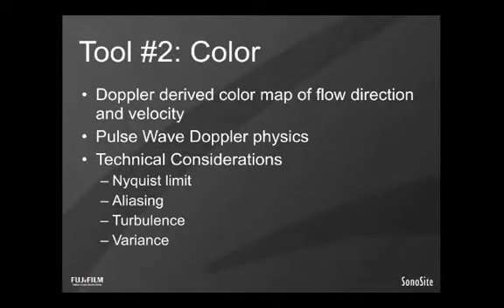So having proved to you the merits of an eyeball technique, we can then move on to the most common method by which valvular lesions are screened for their severity, which is the use of color. Now, color Doppler is derived from pulse wave Doppler physics, as you may recall, and really it assigns a color map to the direction of flow and allows us to evaluate how much flow, very subjectively, may be going in the wrong direction or maybe accelerating in flow, leading to aliasing. And for those discussions on aliasing, I would refer you to the screencast that we did already on Doppler and hemodynamics.